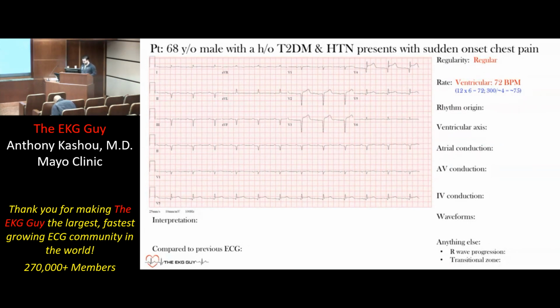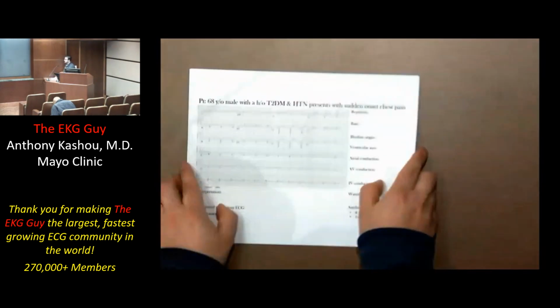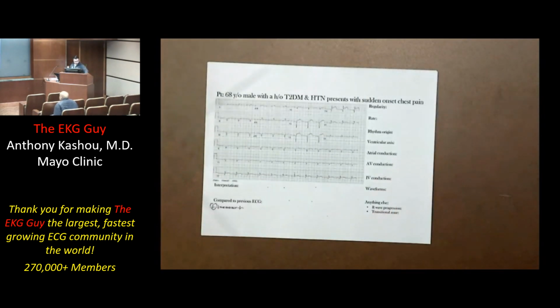So let's take a look at this. That's good. I mean, 2 is a good one to have them in. All right, finally one of the main ones. So let's take a look at right here. So remember, sinus rhythm means that it's coming from the sinus node.